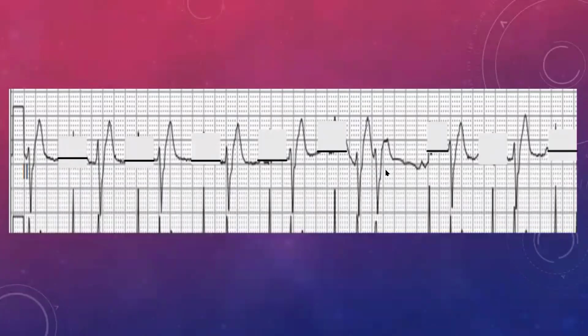The other thing that we notice is that sometimes they're not regular at all. You can see sometimes they come together, sometimes they come separately and things like that. And if we look at them, they're also coming at a rate of 1, 2, 3, 4, 5, 6, at around 50 beats per minute. Although that's a bit off-putting at first, but anyway, we'll get into it later.